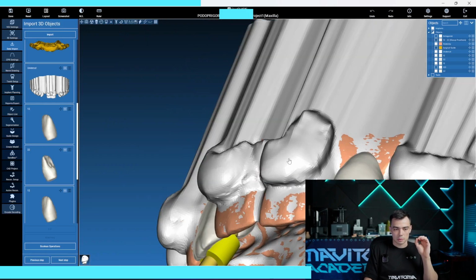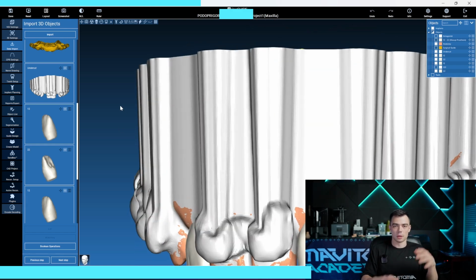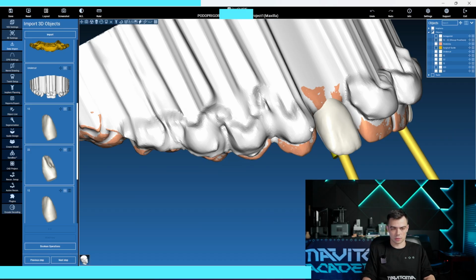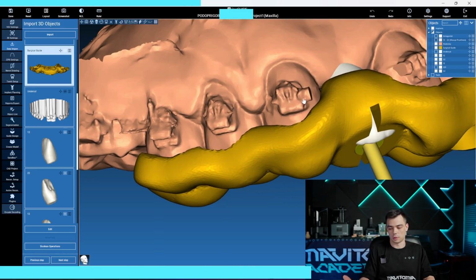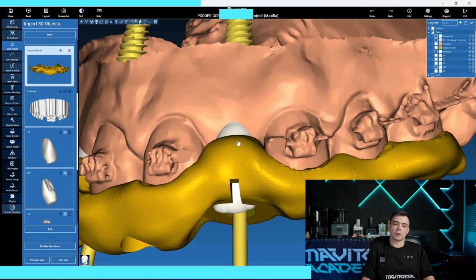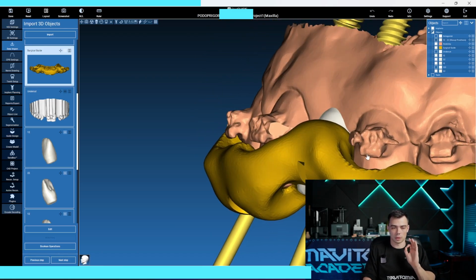That's why we made a special bumper, we made a special security zone just to avoid the contact of the hard surgical guide with this area, not to let it cause the malposition of the guide, not to make it shake on the teeth. And that's why by making this bumper, by making this security zone on braces, we avoid any contact between the surgical guide and the pieces of braces, making the surgical guide based only on the occlusal part and palatal part of the teeth and a bit of the vestibular part of the teeth, but not being in any contact with braces.